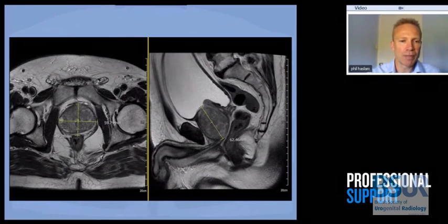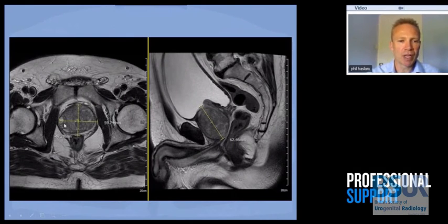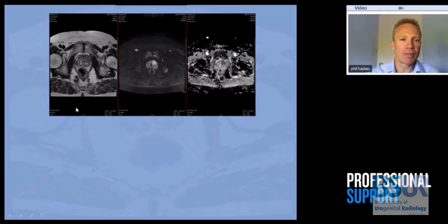So I'll give you an example. Here's a patient with BPH. They've got a large gland. They've got the transitional zone grossly expanded here. The peripheral zone is fairly well compressed. So I give the dimensions in those two dimensions. And then on a sagittal scan, I get the craniocaudal dimension. You multiply the three together, times it by 0.52, and that gives you an approximate volume based on an elliptical formula. I'm sure some of the more modern PACS systems will be able to give you a more accurate figure than that.